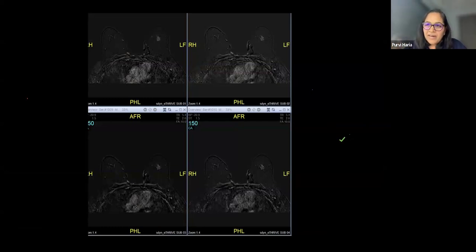So right now we take the ultrafast sequence and also the routine dynamic, probably to know the spatial resolution better with this sequence. So we are still taking both sequences. We start with the mask phase, we inject contrast, and we take an ultrafast sequence. When it finishes, the routine dynamic sequences start immediately, and we probably decrease the number of routine dynamic sequences and do the scan for these cases.